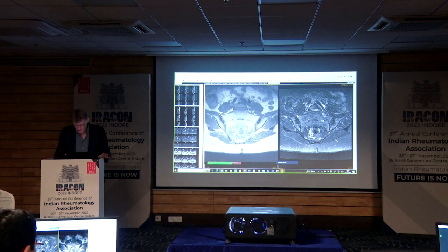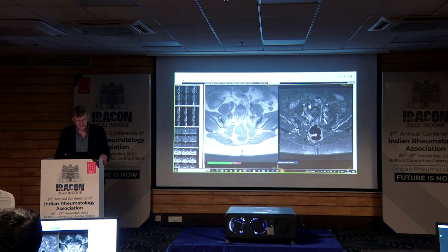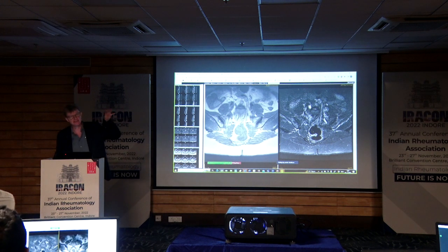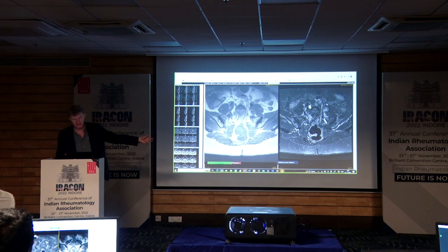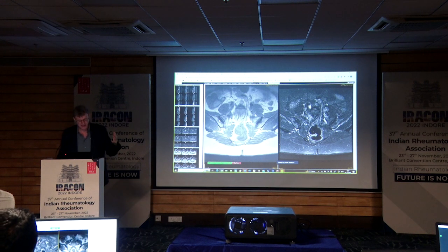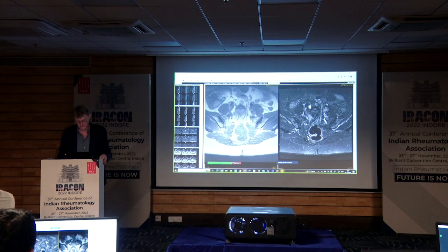Right, so this is osteitis condensans in the typical presentation, and it's not always as severe, but it's always in the anterior part. And it's mainly women who have given birth at some time point. So the first question when I see something in the anterior part, when it's a woman, is has she had children? And if she doesn't, then you have to consider why it is so, but it is often like that.